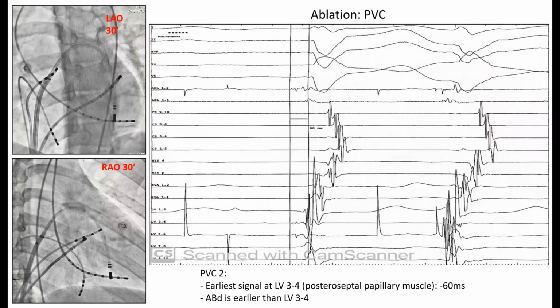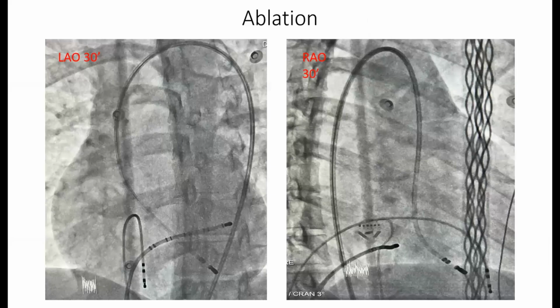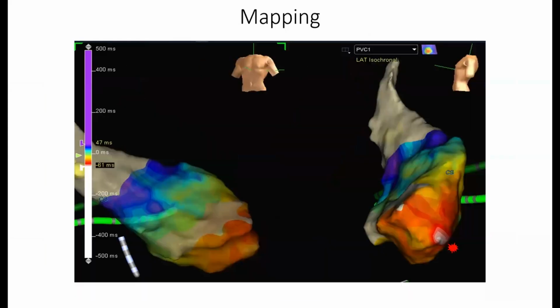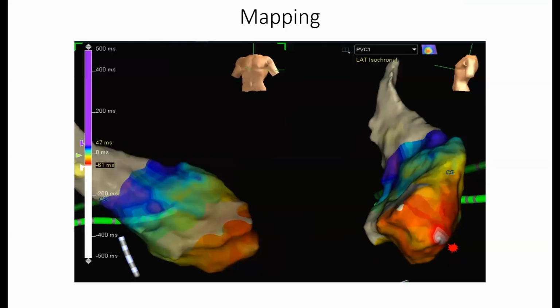That's why I asked you earlier whether you had any scar tissue in your 3D mapping when you performed the second procedure. So if you go back to your second map, the second procedure, let's look at the voltage map. Take a look. Okay, this map was created by the grid catheter, right? I have two questions for you. Right there, go back to that first map. In this map, you have two white spots. Do you agree? One is lateral, the other is where you put the red arrow or red star.